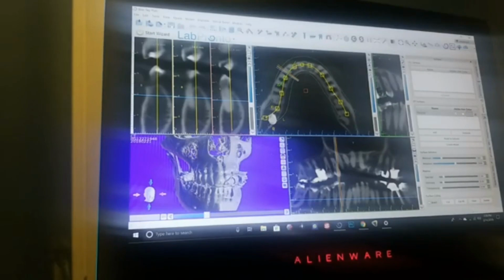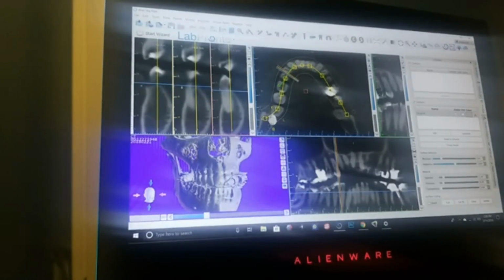Okay, because I can page through the axial images one by one. I can go over here with this cursor. Take a look at my cursor here. I'm right up on top here, okay? And as I'm paging through, you can see the images are changing. As I'm doing this, this blue line, that's the same blue line down here, is moving up, right?